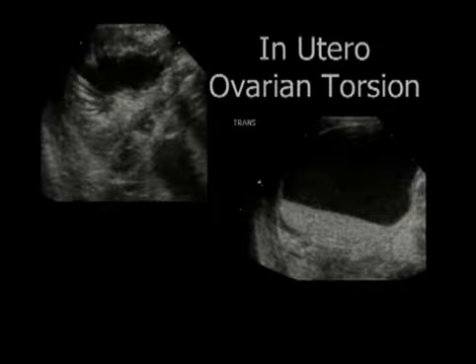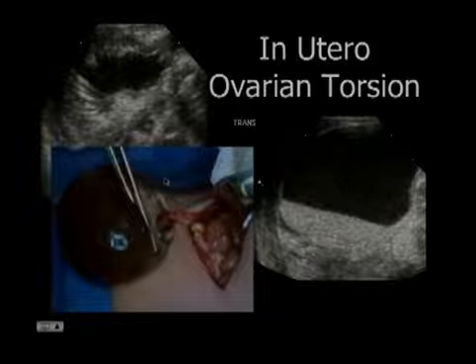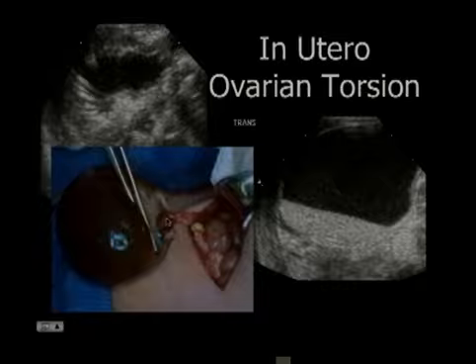This is an in utero torsion. A child with a cystic mass seen in utero was born, and we see this complex fluid-filled cyst with a debris fluid level. And down at the bottom there was this kind of swirling pattern down toward a central pedicle at the base of this mass. And at surgery, I think you can see here is the pedicle, the torsed necrotic ovary, and we were seeing this sort of swirling of the base as it came down into this twist.